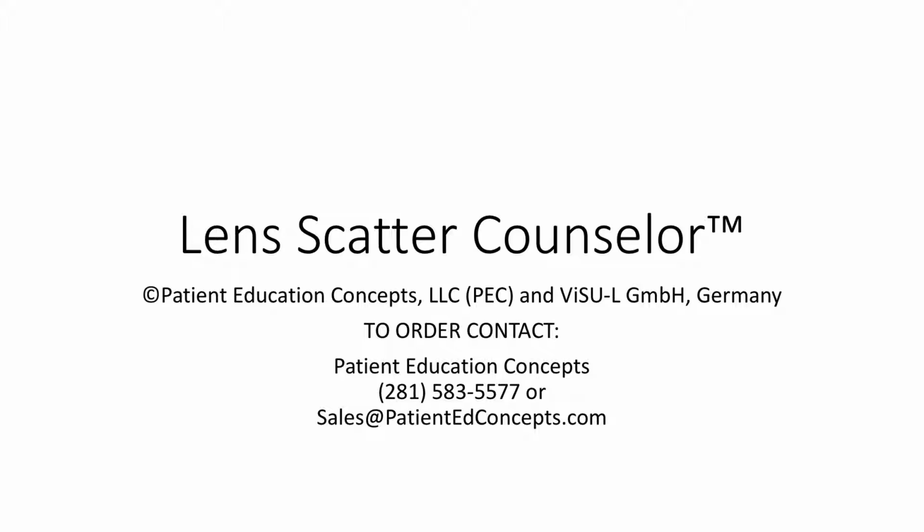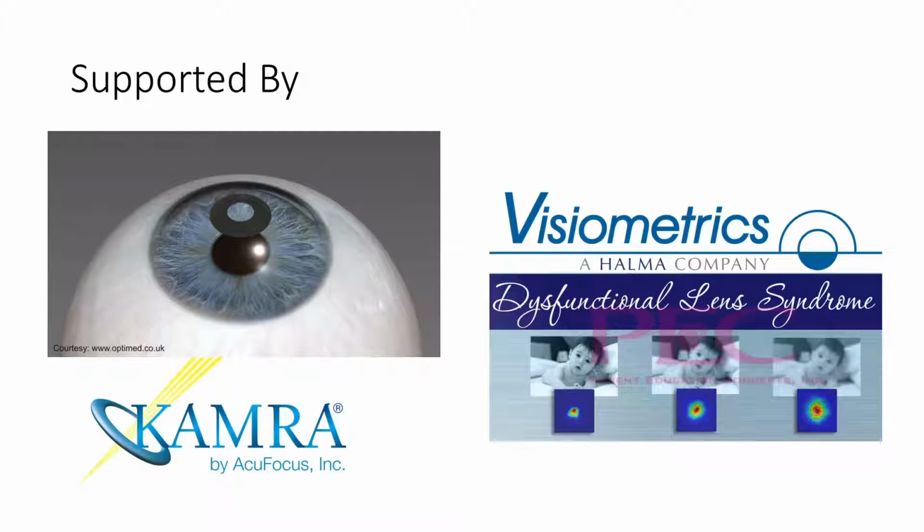This short webinar will give you a brief overview of the Lens Scatter Counselor that's now available from PEC to help you explain how a patient's ocular scatter index, or their OSI, can affect their vision. The Lens Scatter Counselor was created with the support of AcuFocus Incorporated and Visiometrics and intended for practices that use the AcuTarget HD Analyzer or the Visiometrics HD Analyzer.